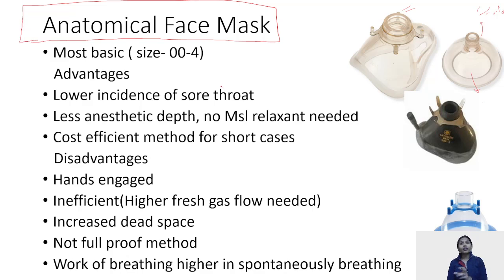The advantages and disadvantages of various airway equipment are generally asked. Of course, this mask helps us in giving oxygen to the patient. It helps in ventilating the patient. It also helps in giving positive pressure ventilation to the patient till we can have a definitive airway.